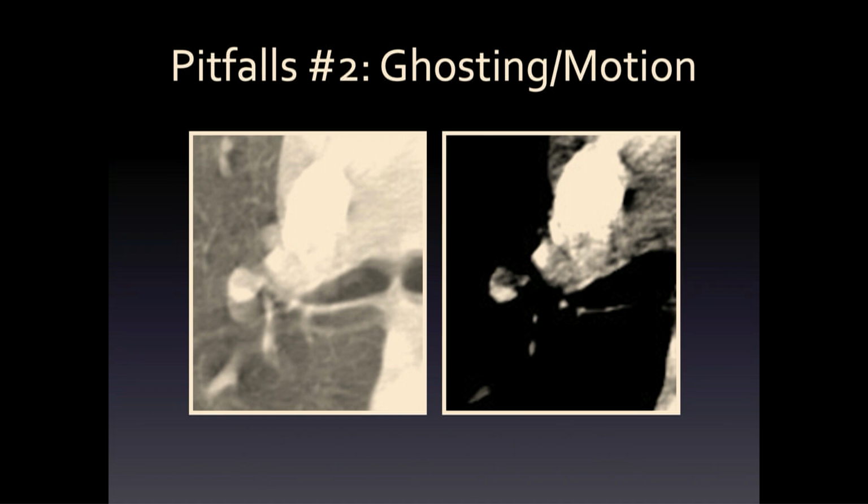So there's the soft tissue. And now I'm showing you lung windows. My favorite thing, right? Go back and forth and see if you're still convinced. So in lung windows, here I'll copy that vessel off to the side. But what do we see on that bigger picture?